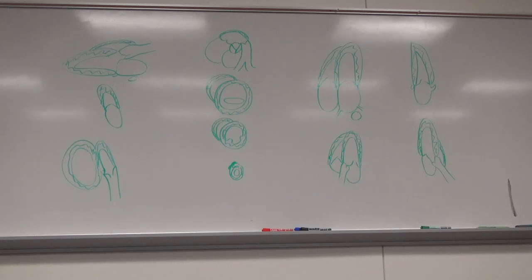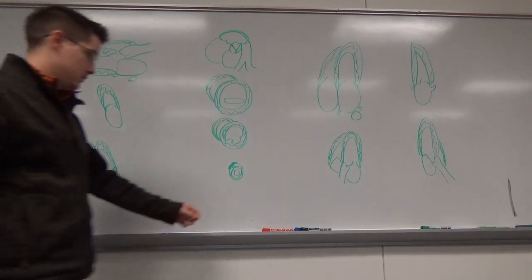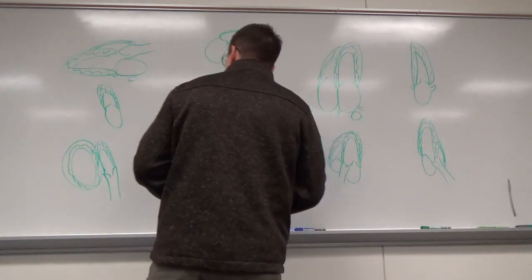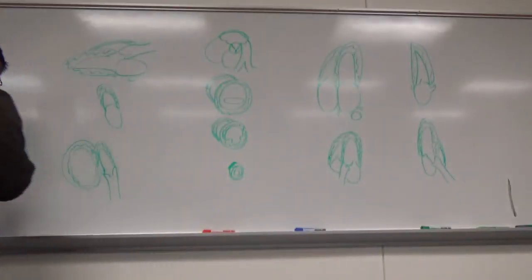Anybody want to label? Ed does. All right, go for it. You learn better by hands-on doing it, so we'll walk through it together. Probably use these markers up here better. The red one I don't think shows up very well, so maybe try one of the other ones, blue or black or something's fine. All right, so what are we looking at?